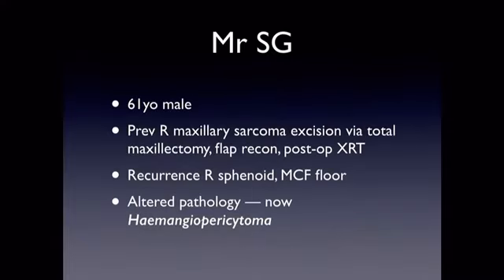So this is a gentleman who's had previous surgery. We're going to move backwards through to the skull base a little bit now. Previous surgery, and he's had a sarcoma removed, had post-operative radiotherapy, he's had a flap put in there, and he's got a recurrence. He presented with nasal obstruction and nasal bleeding.